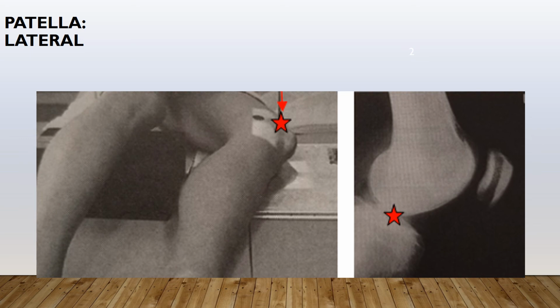When we're evaluating the image, the patellofemoral joint and femorotibial joint are demonstrated in profile. The patella is in profile and the patellofemoral joint is open. Soft tissue and sharp bony trabeculation are clearly demonstrated.